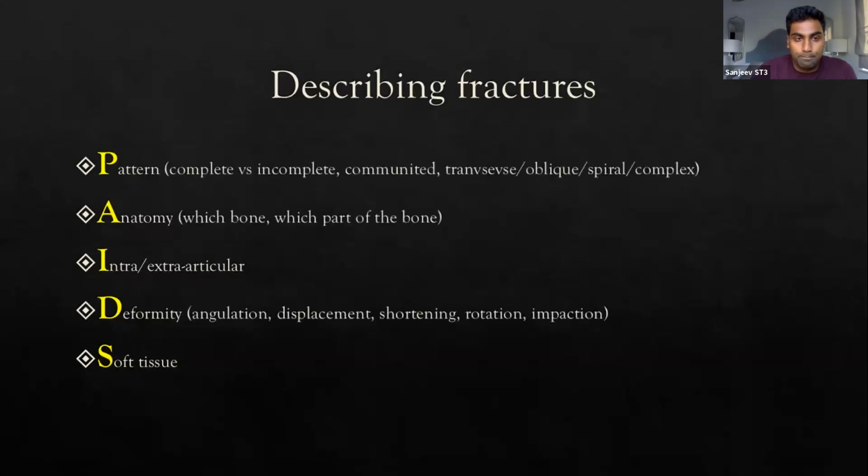And so what do I mean by that? So if you see a fracture, describe the pattern. What does it look like? And I've put in some phrases in there that you might find useful when describing. So first thing I say, is it complete or incomplete? Is it going all the way through the bone or just partway through? Comminuted, does anyone know what comminuted is?